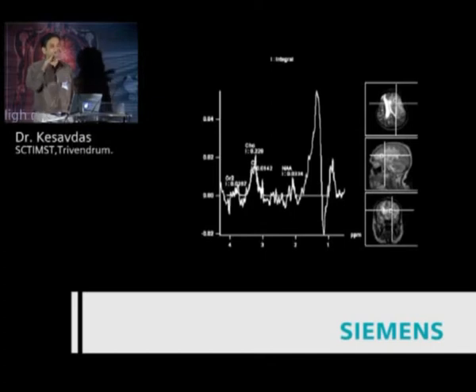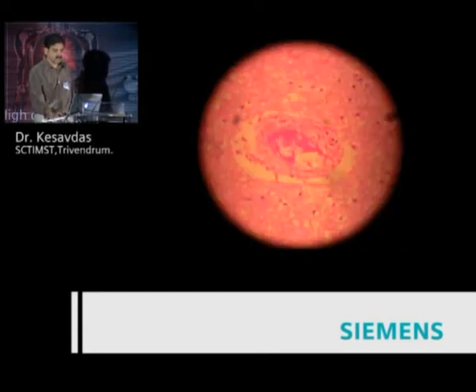But remember that radiation necrosis can always coexist with tumor recurrence. So you should again look at the multivoxel spectroscopy, look at areas where there is high choline, and look at areas where the choline is low and the lipid lactate peak is huge. So these things have to be remembered. And also very important, perfusion imaging is a very good technique in differentiating between these two conditions. So that was a case of radiation necrosis.